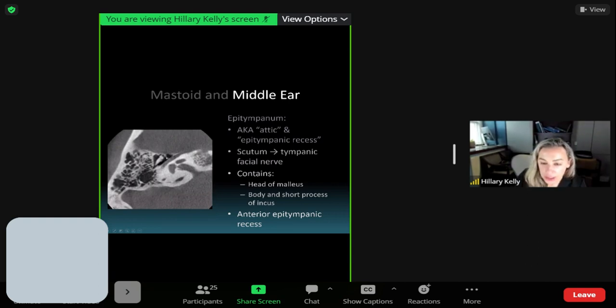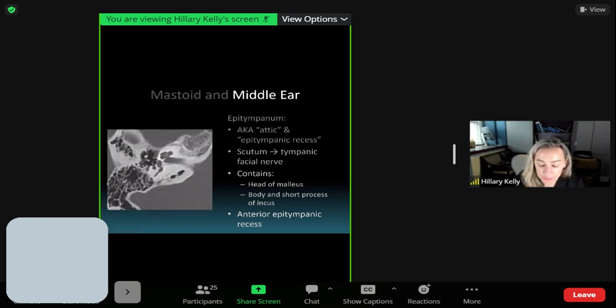As you go a little bit more inferiorly, you start to see this piece of bone called the cochleariform process, okay? Dr. Curtin used to say that back in the day, the neuroradiology CAQs in the US were a big oral exam that they used to do in person, and he used to say that if you said the word cochleariform process in that exam, you passed. And I was always like, what's this bone? So it's this little piece of bone here.